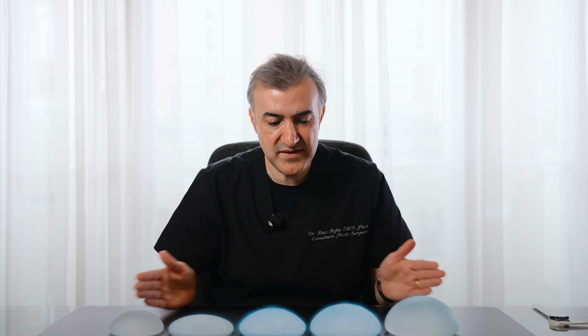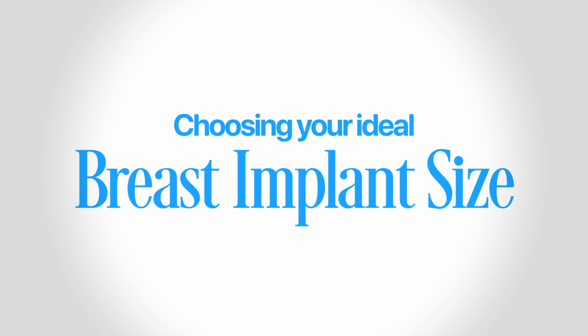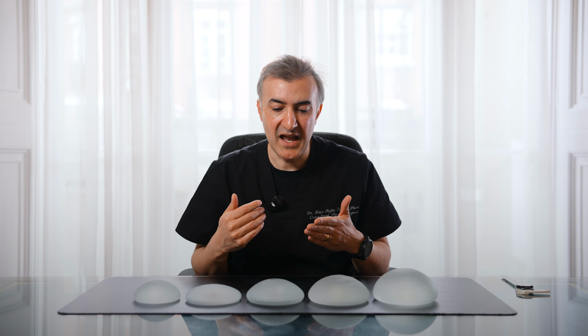Here we've got 5 different breast implants, all different sizes. How do you select the right size breast implant for you? This is a conversation between your surgeon and yourself. You'll need to tell them about your goals. You'll need to do an examination of your anatomy. And from that, you'll ultimately get towards the size.